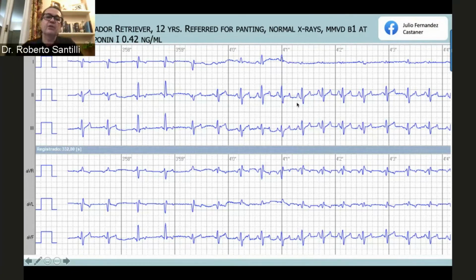So my diagnosis for this is that when it has this type of appearance, it is pre-excited, because you see there is a delta wave here and a double-peaked QRS complex. In aVR, it's completely positive. Then when he has a change, the PQ gets a little bit longer and a Q appears, that's the septal vector, and a narrow QRS complex.